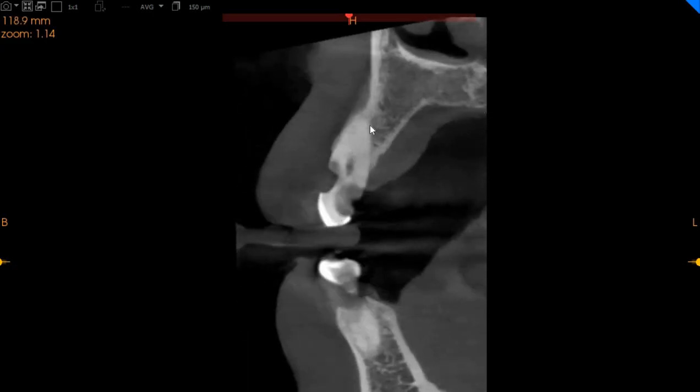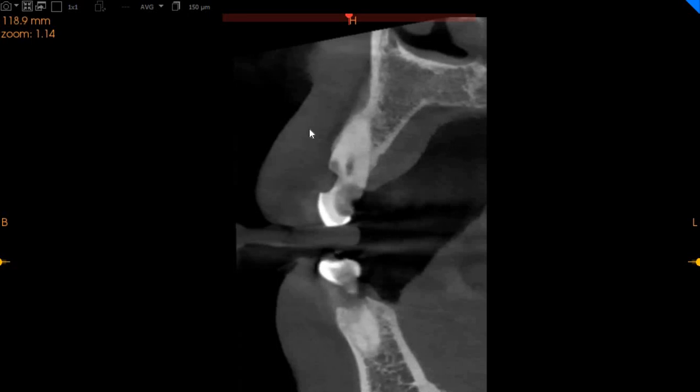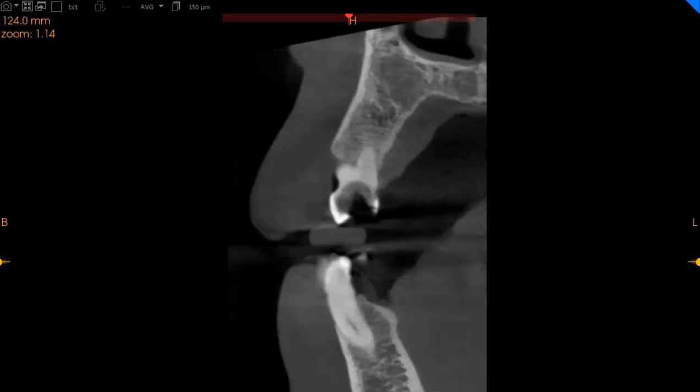We've got an infection in the cavity in the canine, a cervical lesion as well as the overall lesion. Tooth structure is very weak. So if this tooth is to be saved, a post will be needed; if it needs to be extracted, we've got 9 millimeters of ridge width with 23 millimeters of height. Just below the apex, the bone goes to 8 millimeters. So that's a buccal depression that needs to be kept in mind when implant placement is being planned.